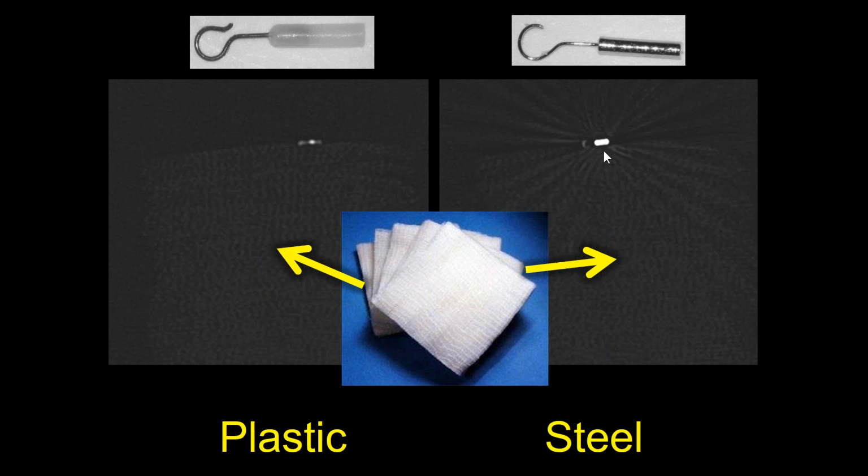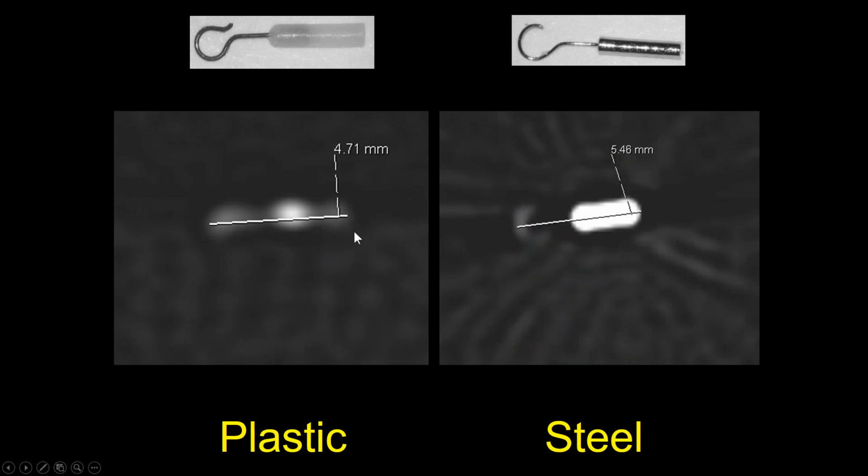And when we zoom in on those models, we get an idea of being able to measure how long those are and think about where the hook is. You see the hook much better with the stainless steel model, but it's very dense with this portion that goes up towards the oval window niche.